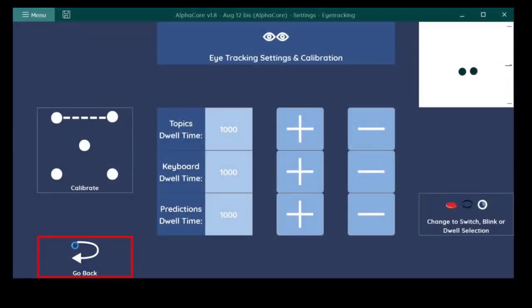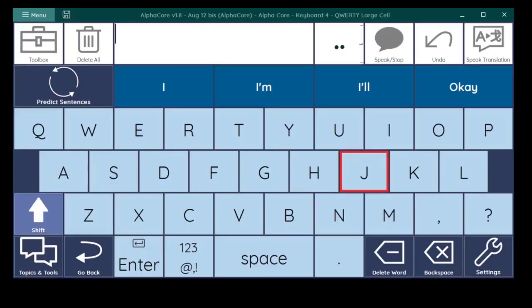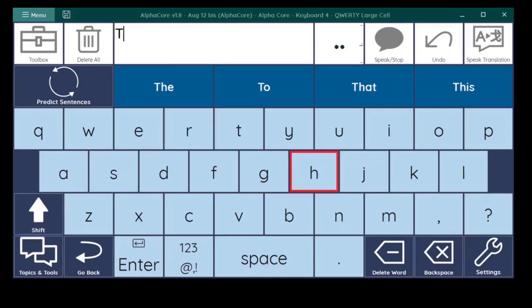Dwell selection. Dwell selection is the default selection method when eye tracking is first turned on and is ideal for users who cannot move other parts of their body. It also has the potential, with some practice, to be the fastest of the 3 selection methods. It does take a little getting used to, since anywhere you look, you begin the selection process right away unless you pause eye tracking by gazing at the pause button, which also contains your eye gaze monitor.